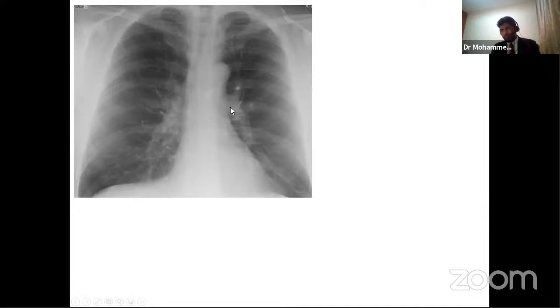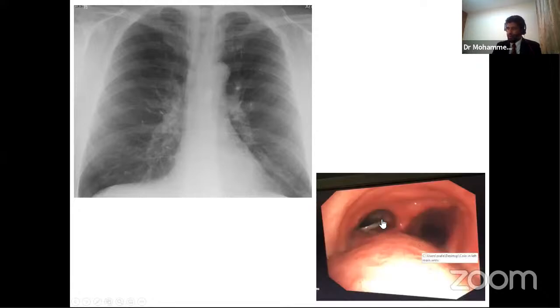Even if the small airways are normal, if the large airways are blocked or compromised for whatever reason, then the patient is in trouble and we are in trouble. And clearly we can see something blocking off the left main bronchus. This was obviously noted on the bronchoscopic view. It's important to send this patient for a bronch to have a look at the airways from inside.